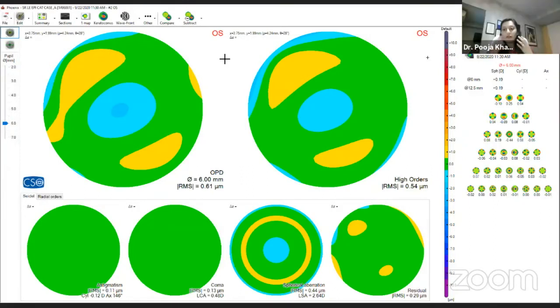So one more point I wanted to ask your suggestion on, because if you see the epithelial pattern here in the higher order aberration, it is more going towards the keratoconic type of epithelium. So when your pupil size is larger, though it is not accounting for the refractive error here, the epithelial profile is like a keratoconic case.